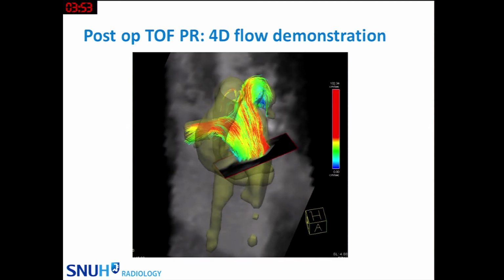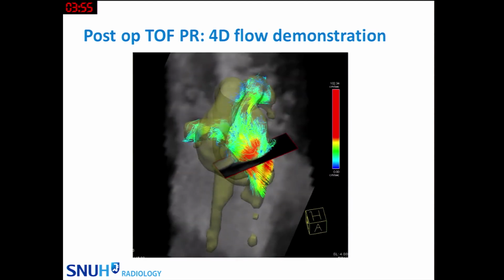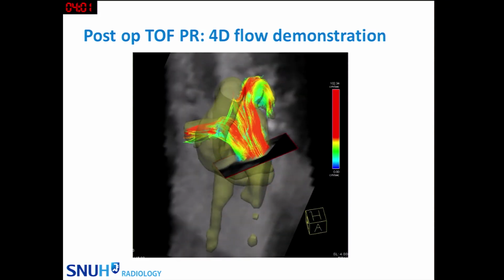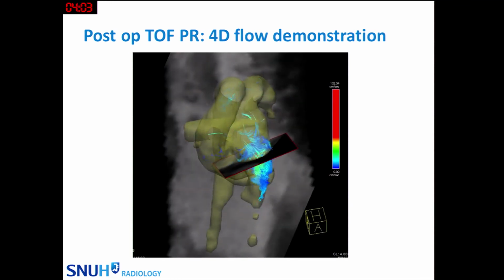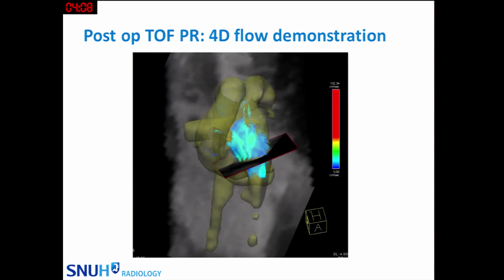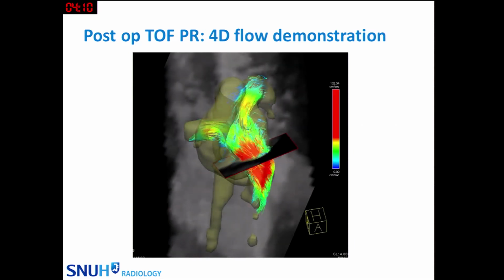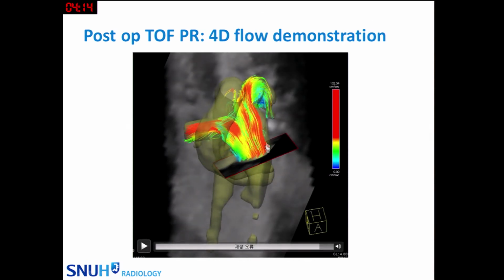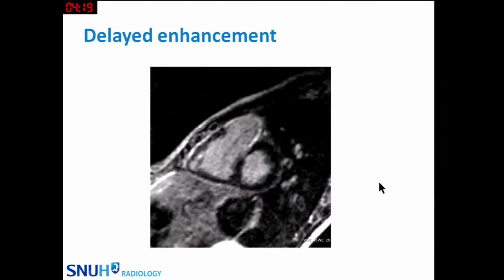The problem with this imaging is that it takes so long, maybe 10 to 15 minutes, and the temporal resolution is still very low. But anyway, we can see this blood flow in the vessel, like laser particle tracing in hemodynamics or for some flow dynamics investigators. Is the image quite nice? It's quite nice. This patient actually has some regurgitation in the pulmonary artery.